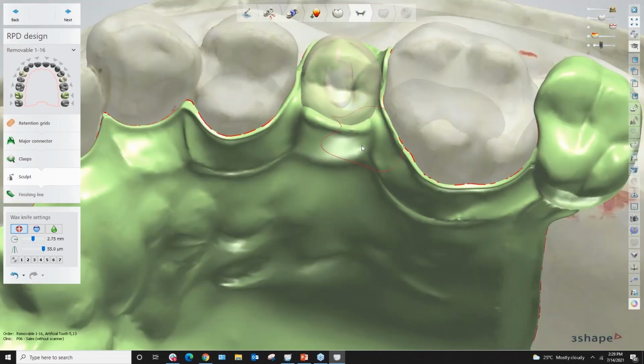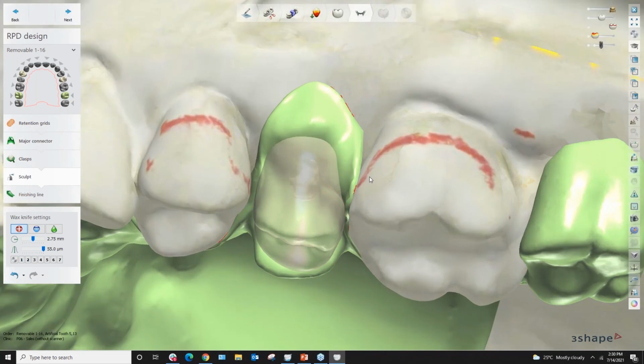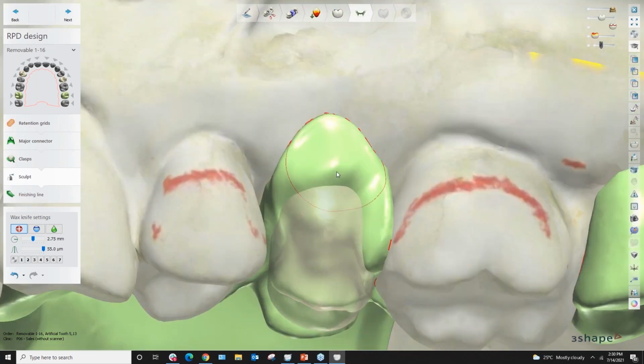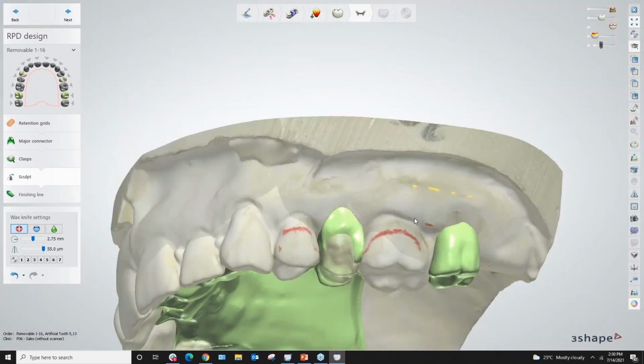It's because I want to maximize my material underneath so that I can have full control near the end of my design to smooth out the areas which are more interesting for me after the pocket has been created. And I'm really going crazy on this particular area right here. I'm not really concerned about it because once the pocket is created, I'll have better control.